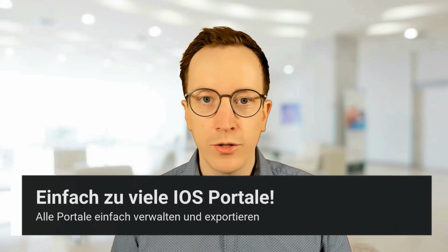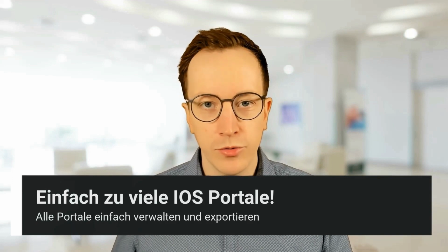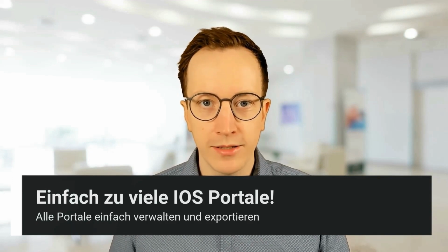I would like to demonstrate the intraoral scan box to you here, which we have recently added to the software. I believe that some of you have already received intraoral scans and have also encountered this problem, which is that each intraoral scan system has its own portal for accessing the scans and related information. Ultimately, you have to monitor all of these portals, which can be quite tedious. So there are a multitude of problems, for example, also the management of access data and so forth.